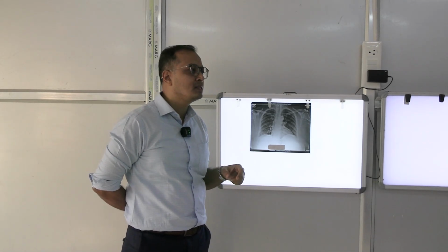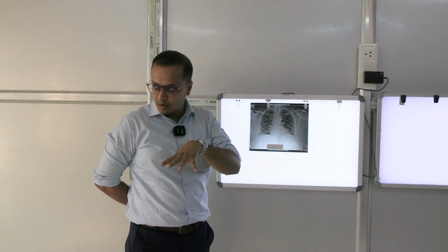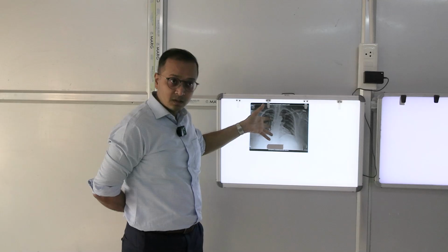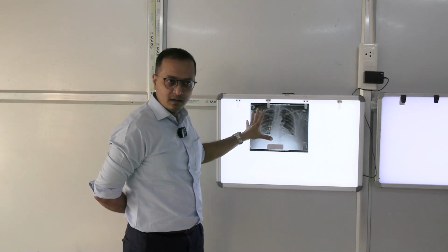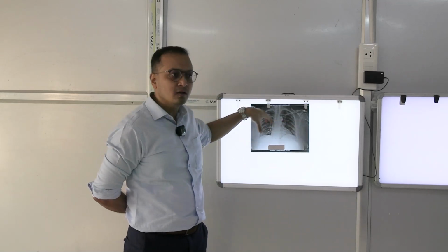Bronchovascular means the lung gets air through the pipes: the trachea, which splits into the bronchus, then bronchioles, etc. Those structures make impressions within the lungs. As well, there are blood vessels, pulmonary vessels, arteries and bronchial arteries.